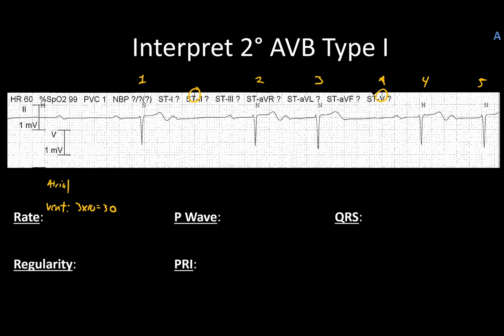because we do have more P waves than QRSs, and we'll say that we are irregular, question mark pattern. There's no ectopy, but we do have more P's than QRS's. Well, how do we prove that? Well, let's go ahead and mark our P waves first. And I will say that this is a P wave, that one, that one.